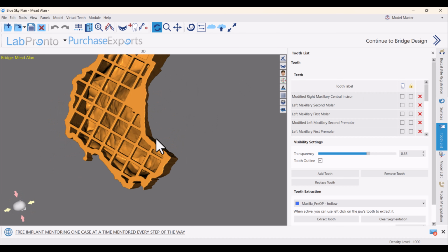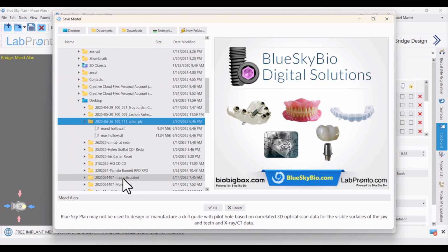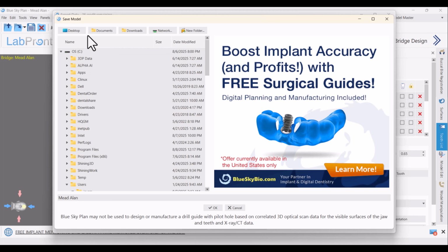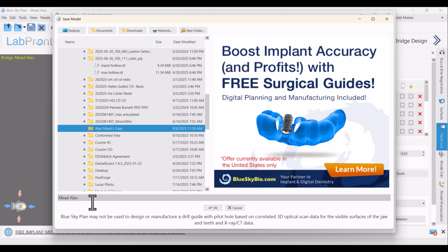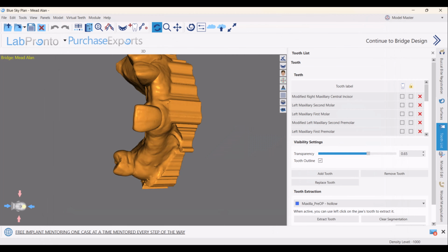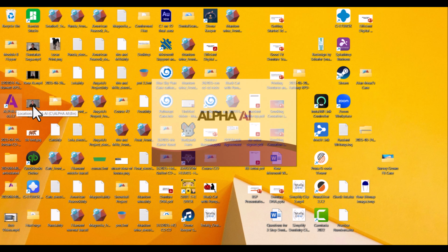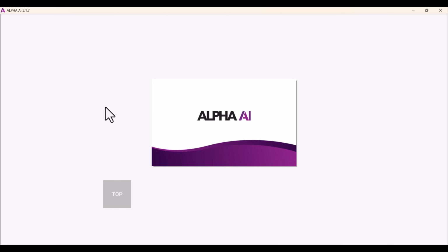in any software that you have. I'll show you doing Accurata. That's what I uploaded on this machine right here. So, let me see Alan Mead's file. Hold on a second here. Let's see, desktop. So, then we have Alpha AI. Obviously, choose the one of your choice.